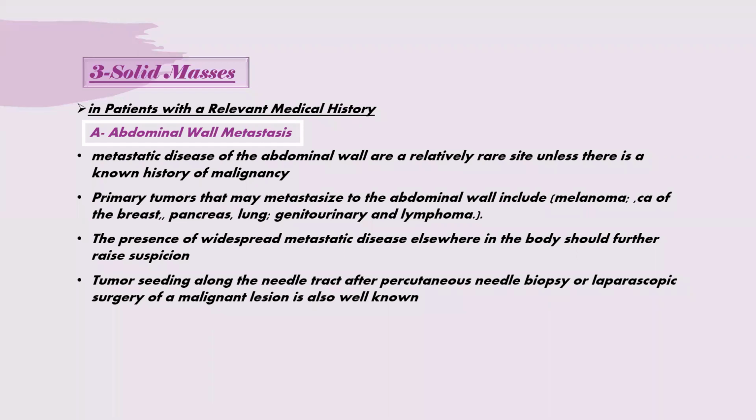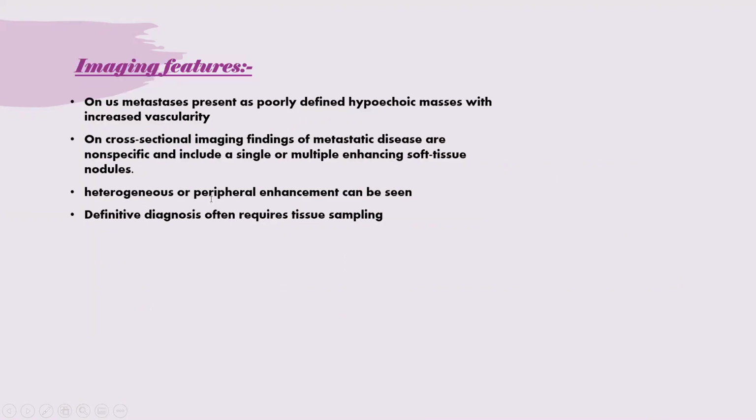Tumor seeding along the needle tract after percutaneous needle biopsy or laparoscopic surgery of a malignant lesion is also well known. Imaging features on ultrasound: metastases present as poorly defined hypoechoic masses with increased vascularity.